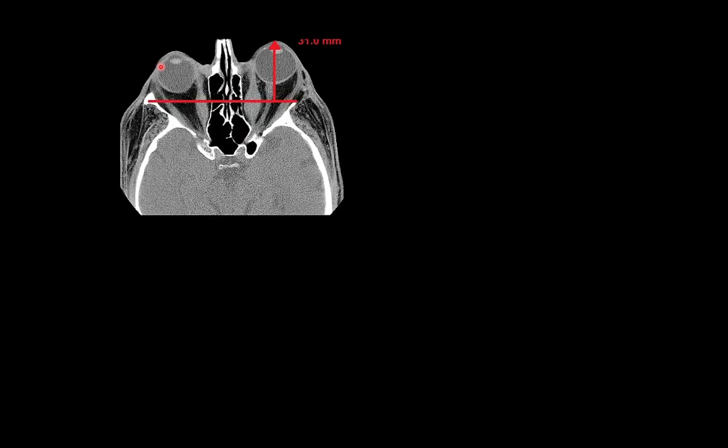This is the same finding. This is to measure the exophthalmos, but here you can see the bulk of the muscle in the medial rectus is enlarged, but the tendon is not involved. If the tendon is involved, this can be seen in cases of pseudotumor or inflammatory process, not Graves' disease. Okay.